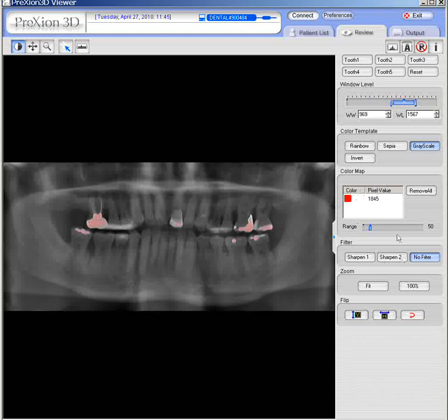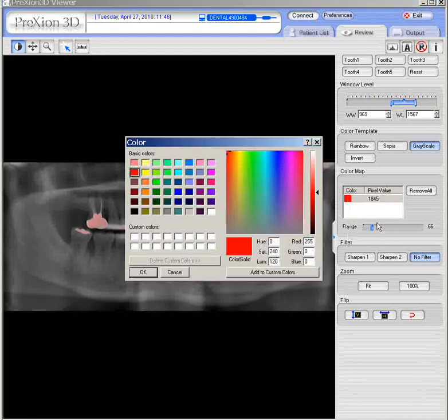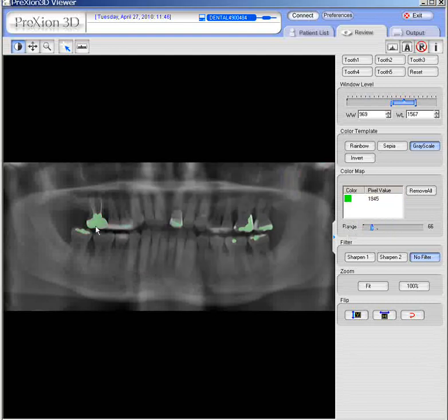Okay, you could select different colors by clicking the color, right clicking it. You can edit the color, and let's just make it, I don't know, let's call it green, let's say. You just click green, say OK. So now your range of all the more dense structures, like metal, you can color those with the color green, see? And you could change those, the intensity range, so you can set your own range and you can change the color in that regard.